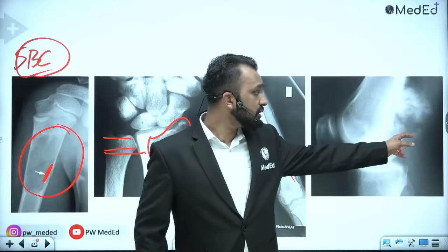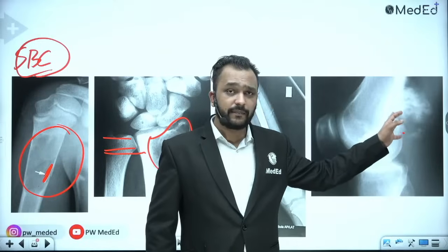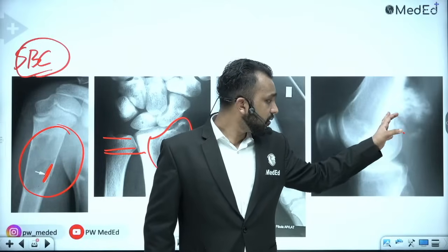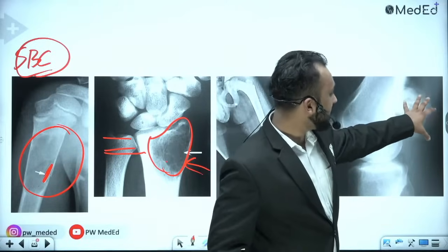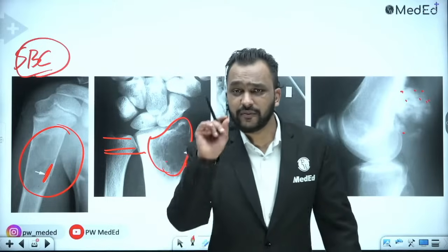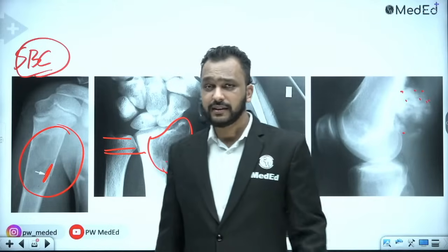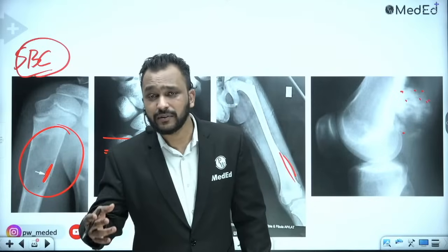And the third is your parosteal osteosarcoma, more common in the femur, lower femur, right, distal femur, where you can see a lesion arising from the cortex of the bone. Another very important juxtacortical lesion that you should be aware of is your osteochondroma, which will arise from the cortex of the bone.